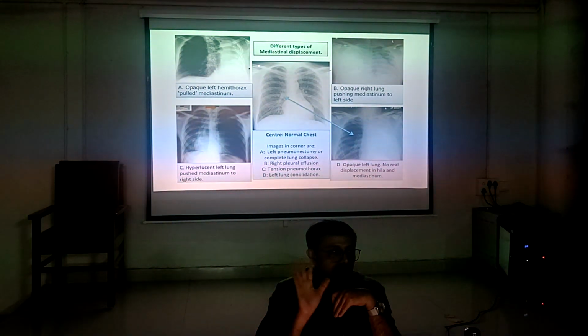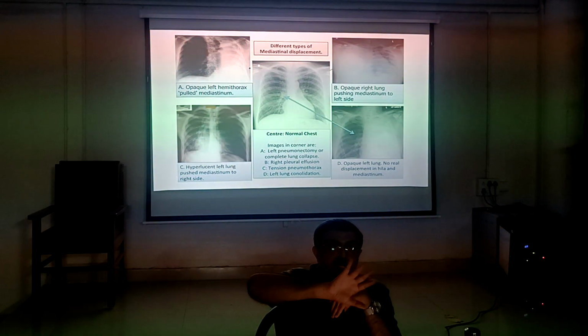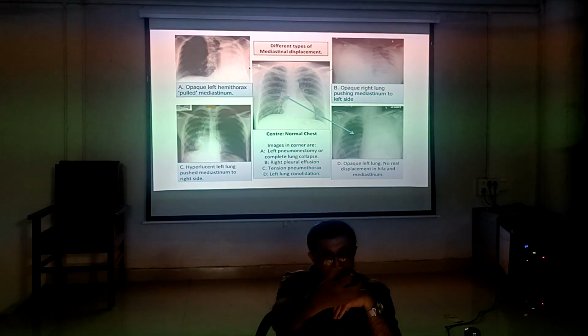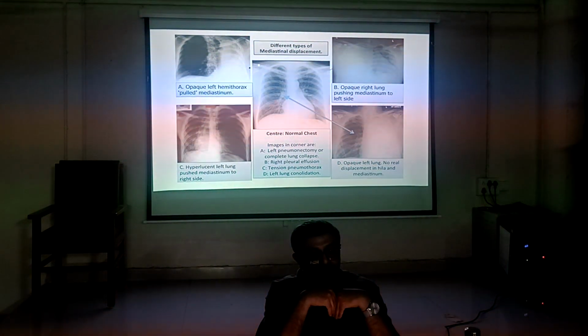Lung નથી તો cavity છે ખાલી. There is a cavity. What will happen? The mediastinum will shift, because the opposite side will have compensatory hypertrophy, and the empty cavity will suck. તો pulled mediastinum થશે. Pulled mediastinum.